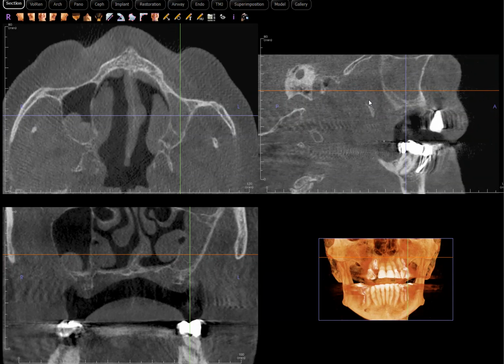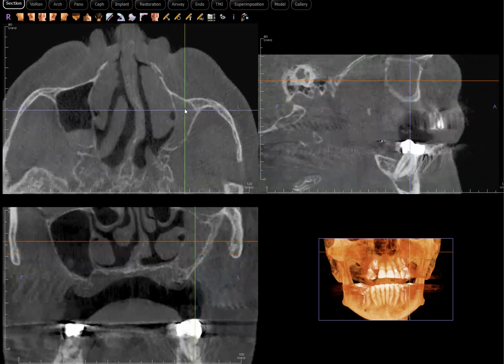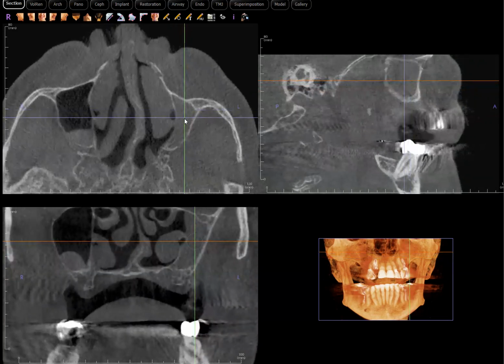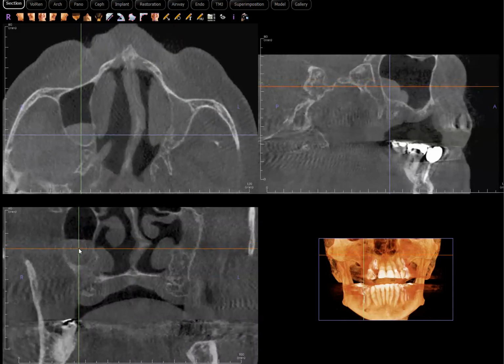Often I don't have a follow-up scan, so it's not easy to share those. But in this case, we have two scans that are taken about a year apart from each other. And I think this is a great example of what could happen if the patient either received a proper treatment, or in some cases, there could be a spontaneous resolution of sinus lesions as well.